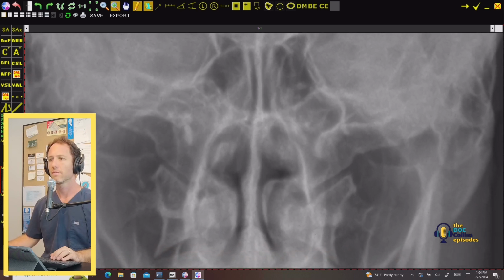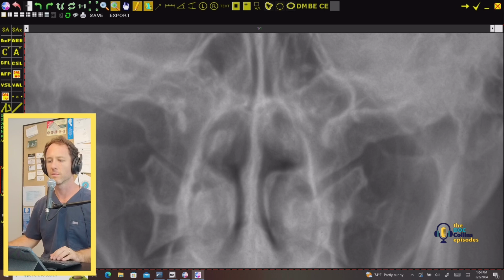All right, so kind of moving down, we can look at the condyles, occipital condyles, right? Just in terms of marking and preparation. So I picked this one because it's pretty clean, so everybody can get a sense. When it would come time to do the aberrancy for the condyles, we'll have this lateral margin of it.